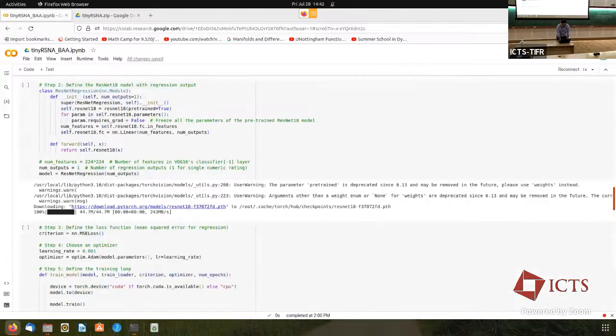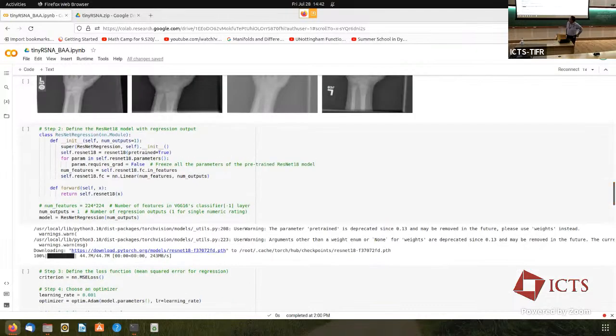Okay, now let's talk about defining the ResNet regression. So, inheriting from nn.Module, I showed you that last time. Again, there is an init that goes into it. I'll show you the essential stuff. So number of features, this last line: this ResNet comes with a certain number of output units. We have to remove that set of output units and place how many units? 1. It's a regression problem. I wipe out the last layer and place 1 unit, okay?